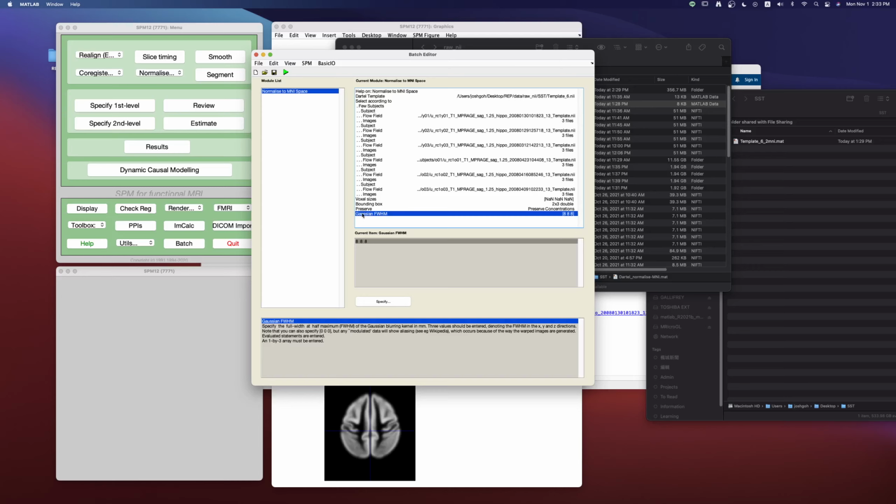our data. Another thing to note here is the preserve option. Remember, as we talked about before when we did segment, when you warp or deform the image, you kind of either shrink or expand the volume or the area, right? And there's two options.